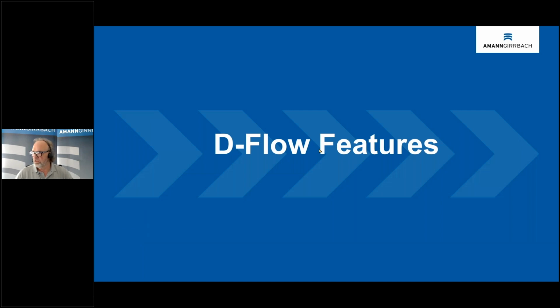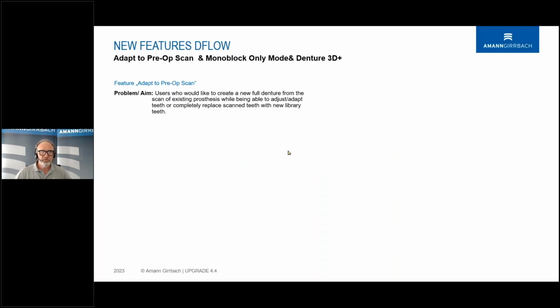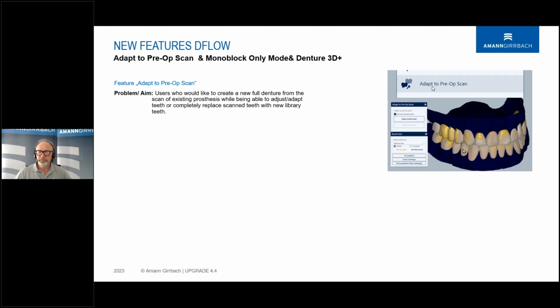We also have a look at the D-flow workflow. D-flow before was FDS, full denture system. Now we call it D-flow because it's a little bit wider. We are able to mill the teeth arches, for example. And we have one more feature here.